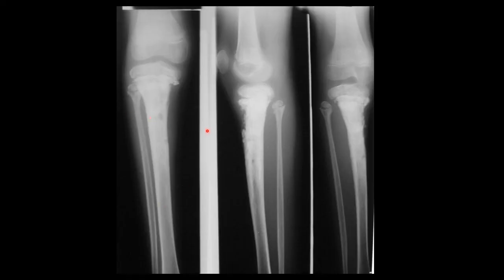Here's an example of a proximal tibia where there's erosions, and you can see there's previous drill holes here. This is a very sad case of a child. You can see the physes are still open, indicative of a child who's presented with a warm, swollen proximal tibia. Frequently, these are misdiagnosed as osteomyelitis due to Staph aureus.